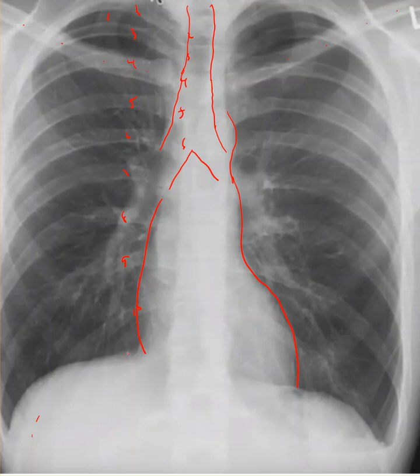D is for diaphragms. Here's your right diaphragm sitting on top of your liver. Then you go over to your left diaphragm, and it's like, well, this looks kind of funny, looks different. The right is supposed to be a little higher than the left, which it is, but this is just a little bit odd. So you look, and this here is the stomach, and this is actually your diaphragm, and it's pushed down or depressed on inspiration. So that's kind of a flag. It's like, what the heck's going on here?